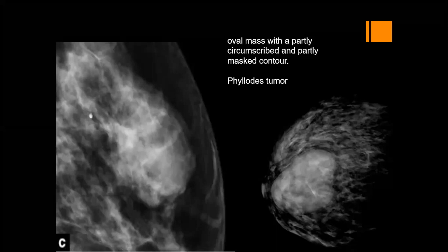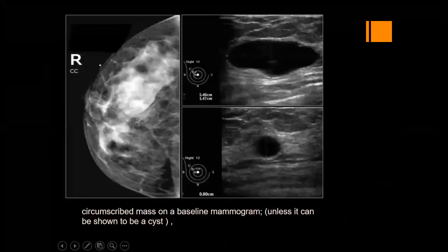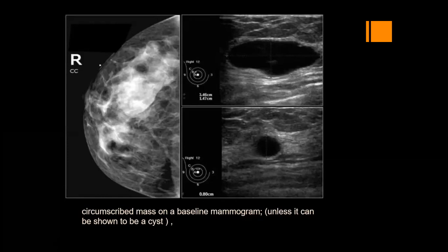the hamartoma, you see, having a capsule, a partial capsule, part of which is encapsulated. We might get confused that this might be a hamartoma. And this is more or less similar to those lesions, but it is circumscribed, partially obscured, seen on ultrasound as just a simple cyst, you see, representing BI-RADS 2. This is the real BI-RADS 2 lesion.